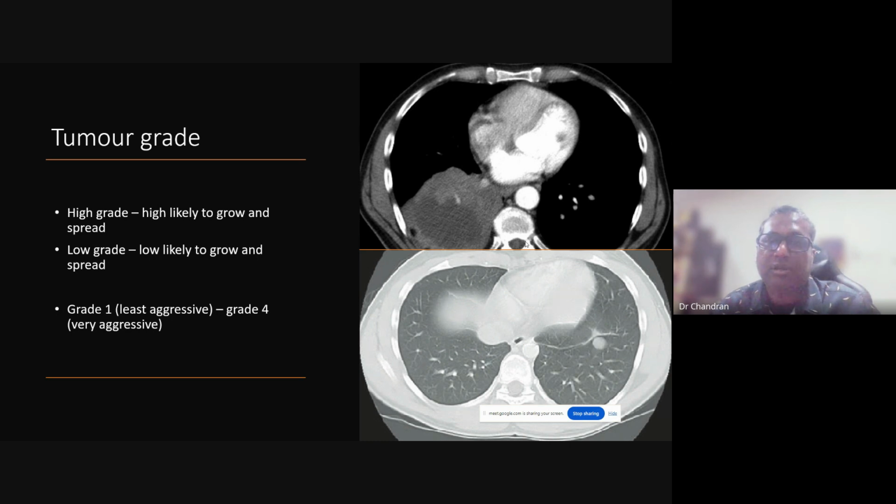Or because the appearance looks big and they have different colors, we know that these tissues are trying to grow faster. Sometimes you can see a lot of vessels coming in, and we know that this is aggressive, because vessels are what bring food. So anything bringing food to the tumor, we know the tumor has a tendency to grow bigger and faster.